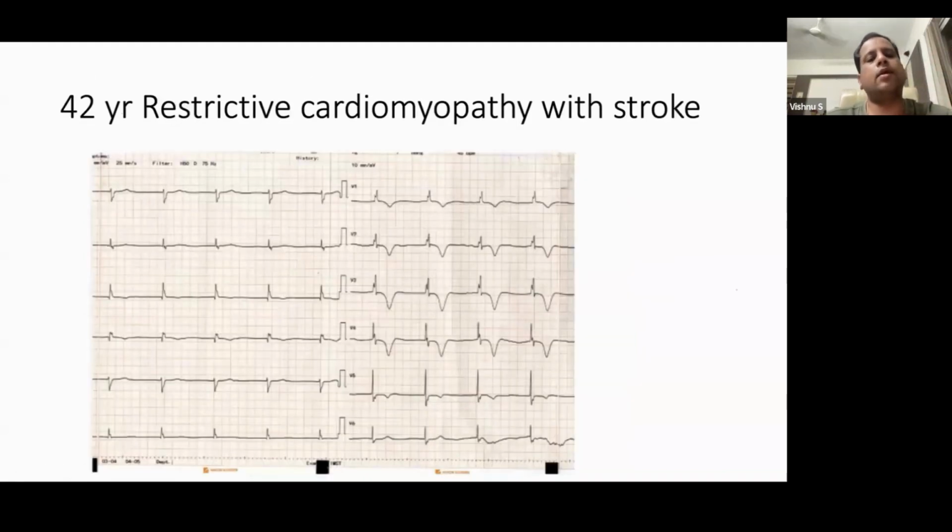Now from the SA nodal level we are going to the AV nodal level. At the SA nodal level we see sinus bradycardia, then sinus arrhythmia, then exit blocks. In exit block, only second degree can be seen on the ECG, second degree Mobitz type 1 and type 2.